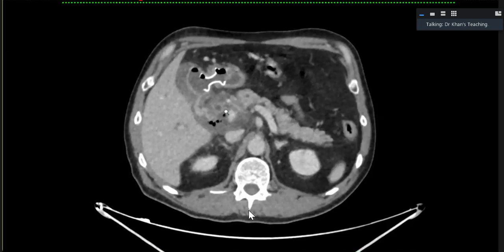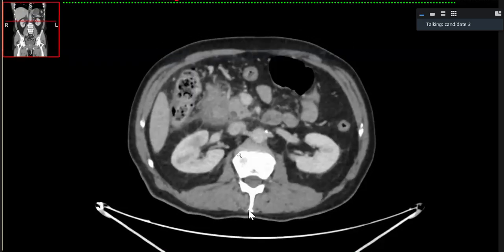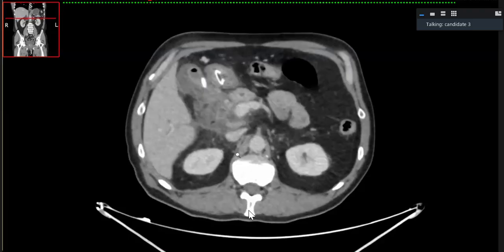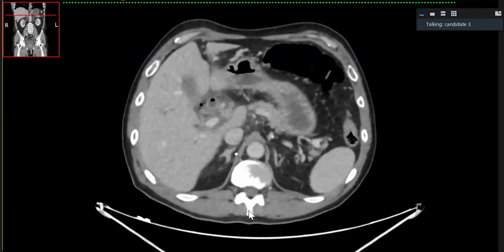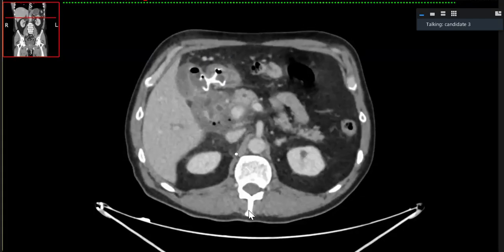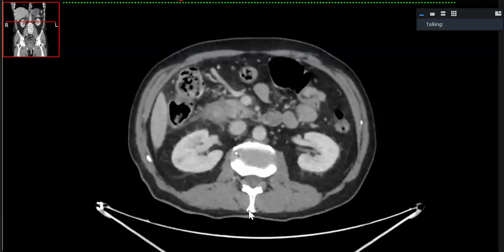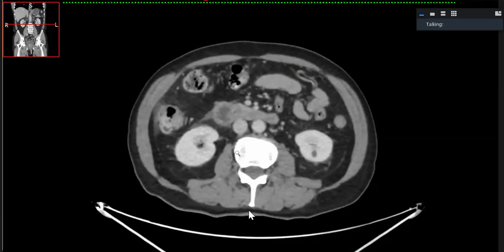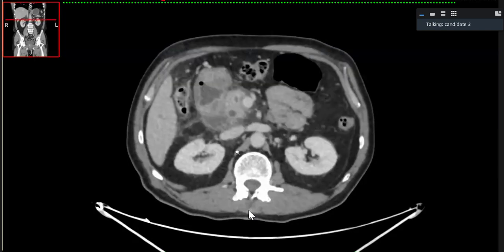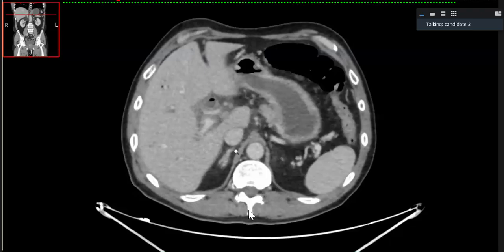Okay, look at the duodenum. Coming to the duodenum, due to its ill-defined outline and periduodenal air density foci, I'm concerned about some perforation in this area, post endoscopic perforation. And coming down further, I cannot see any large fluid collection or mass lesion in this region.